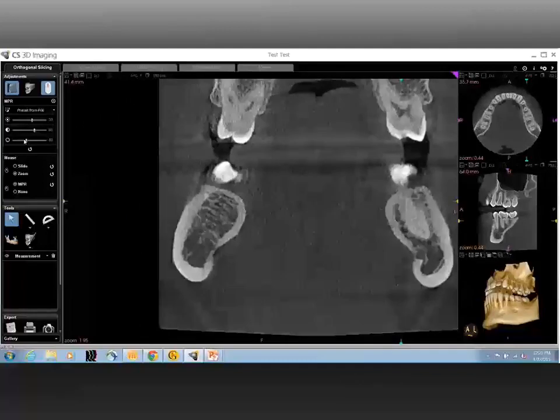Thank you very much. And I think I should have introduced this as being a cursory overview of the mandible. This is not a full radiology read. We're looking with Carestream University to do short videos that cover important areas critical to cone beam CT, but to do them in brief online presentations. So in summary of what you were saying, number one was integrity of the cortical bone. Number two was structure of the cancellous bone. And number three was the trabeculation pattern.